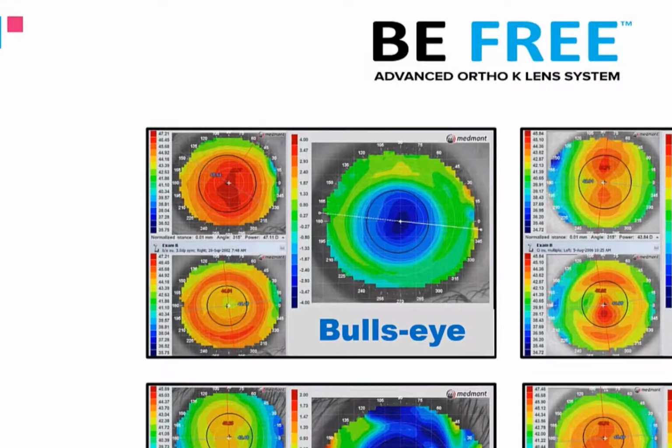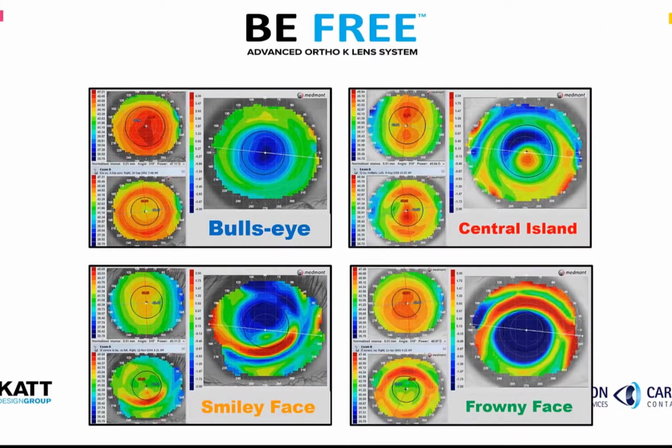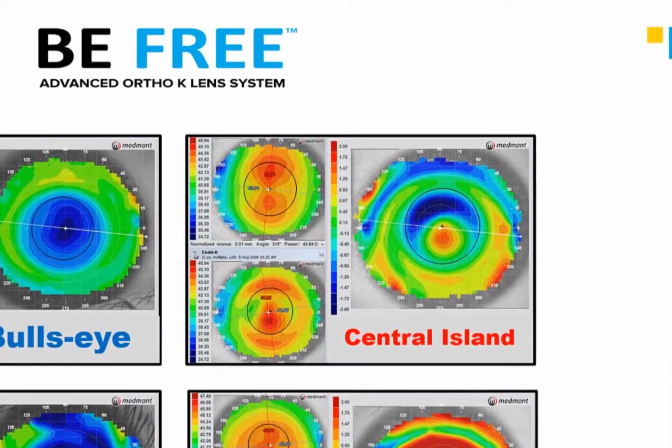The Bullseye topographical response is the goal of orthokeratology treatment. But there are a number of other possible outcomes following orthokeratology lens wear. The central island shows apical steepening and is caused by excessive clearance and often a tight periphery.